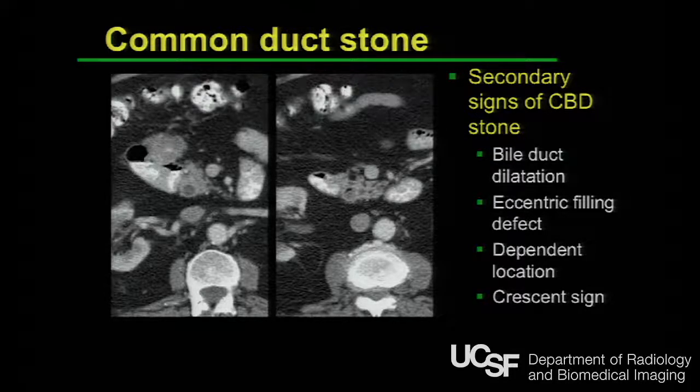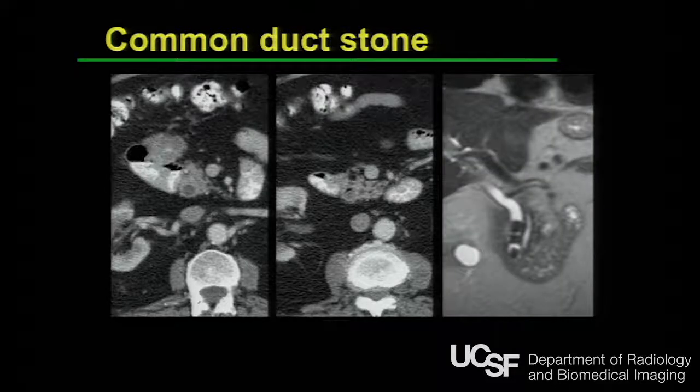So we followed up with an MRCP. Here's a coronal T2 weighted sequence, and we see not just one stone, but 2, 3 stones, and all stones are dark on T2 weighted images. Not true for T1, but for T2 weighted MR images, they're always dark, and they're clustered together. They have geometric borders, facets on them. Those are common duct stones, choledochal lithiasis.